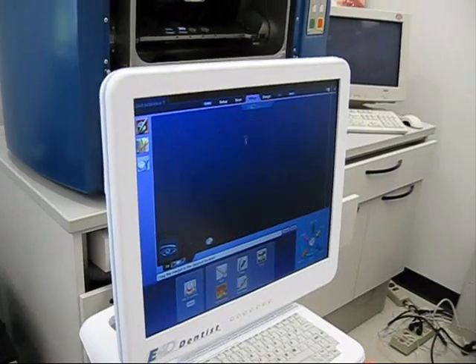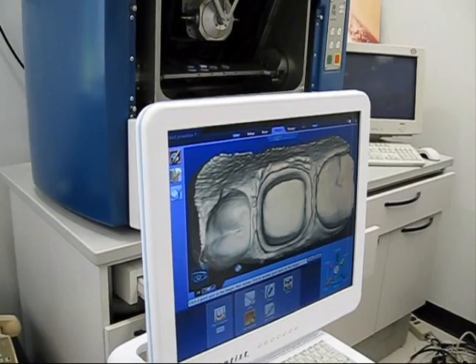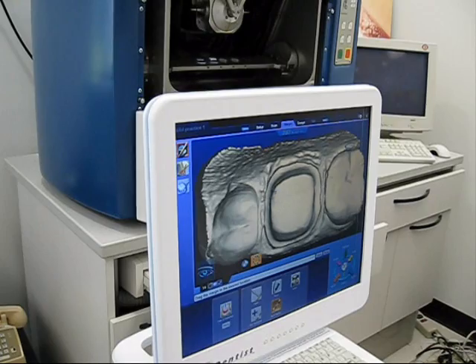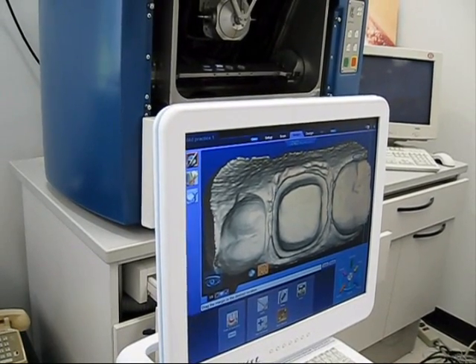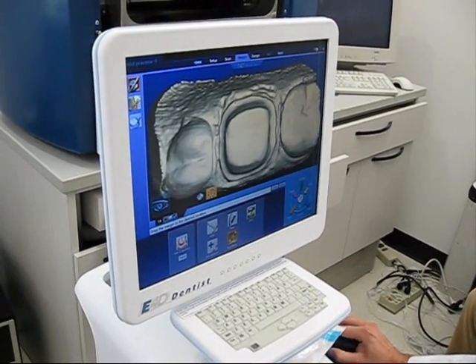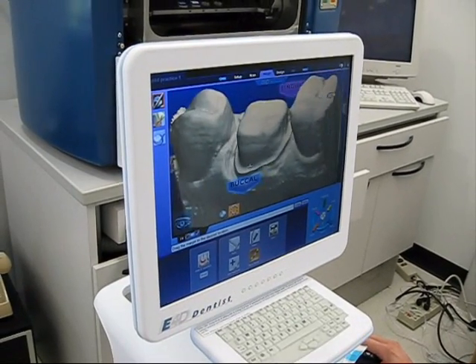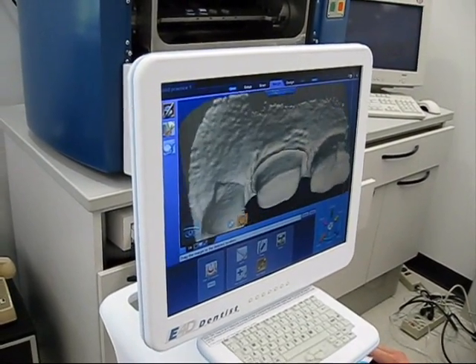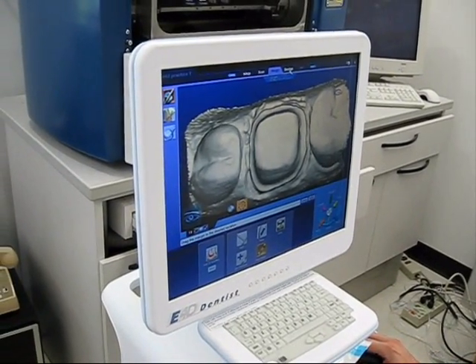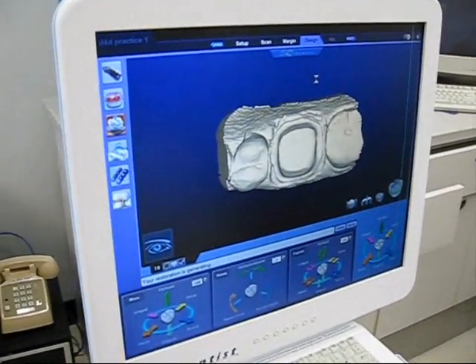If you need to touch up some areas, you can remark those areas, or you could simply move the margin wherever you feel it needs to be moved. And you can change the zone of influence if you just want to move a little area. But anyway, you can spend however long you want marking the margin. You know, it'd be nice if Sarah had a couple of these little tools in it. So let's pretend we're satisfied with that margin. We'll go through its automatic generation feature here.